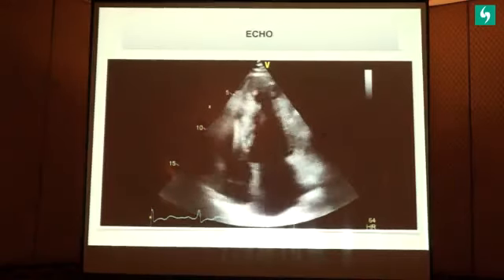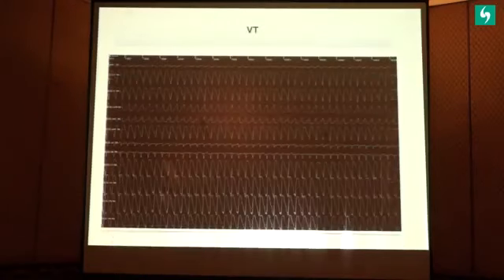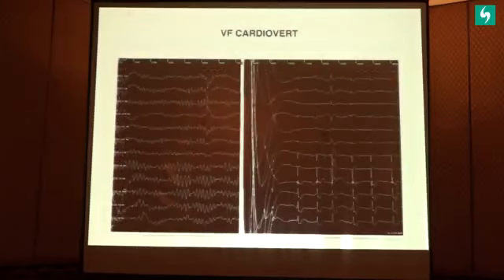So this patient had an apical hypertrophic cardiomyopathy. He had one history of ventricular tachycardia, so he got a defibrillator for the VT. And this is the echo. So clearly the apex is aneurysmal and not contracting. And these are the PVCs. Now you see this PVC, you will see that lead 1 is negative and leads 2 and 3 are negative. This is basal, V1 to V6, V1 to V3 is positive, telling you that it is arising from the left ventricle.